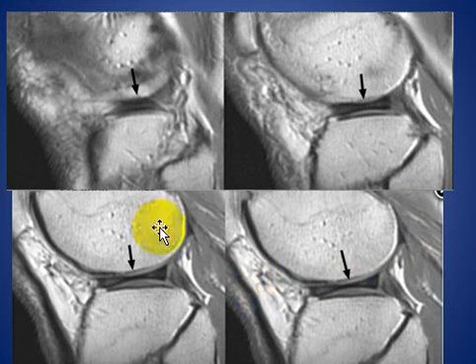If we see the bow tie appearance in more than three sagittal slices adjacent to each other with 5 mm thickness of each slice, this indicates the continuity of the meniscus between the anterior and the posterior horn, indicating discoid meniscus.